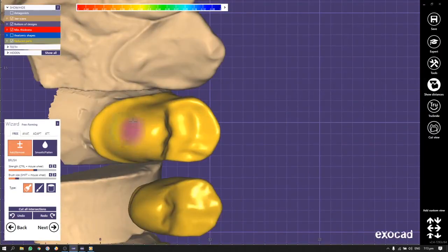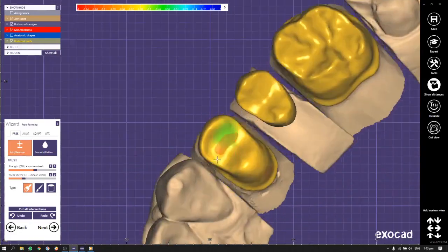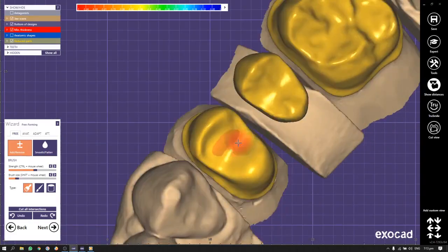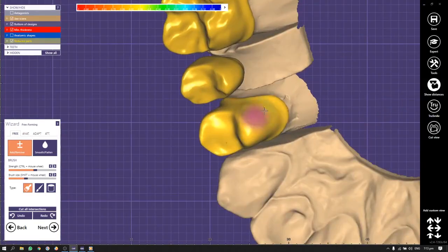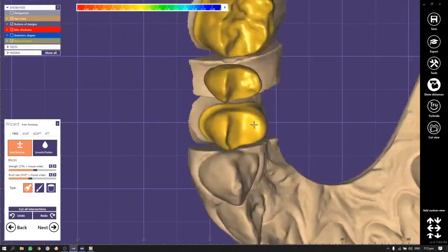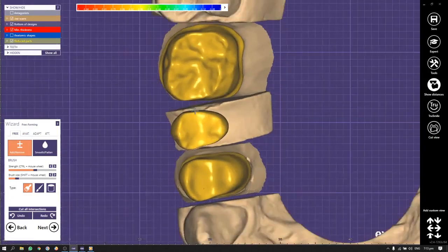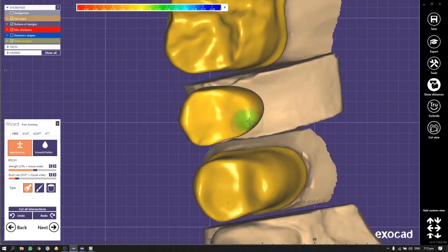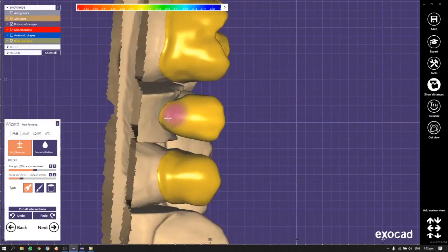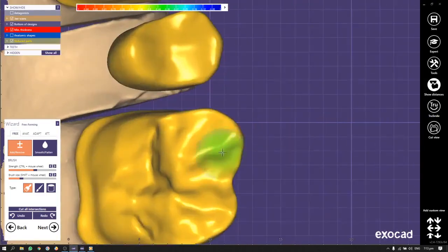For this unit practice, you won't be able to remember everything. You'll be mixing, so you need several hours to make the design and to train. I call it also a play game. So you just several times doing it, adding, removing and smoothing. When I'm adding, removing and smoothing, I understand that I'm changing the initial size and proportion of the framework. That's why I'm trying to work at the same zone that the program gave me. Here you take notice, I edit, so I smoothen it but edit.